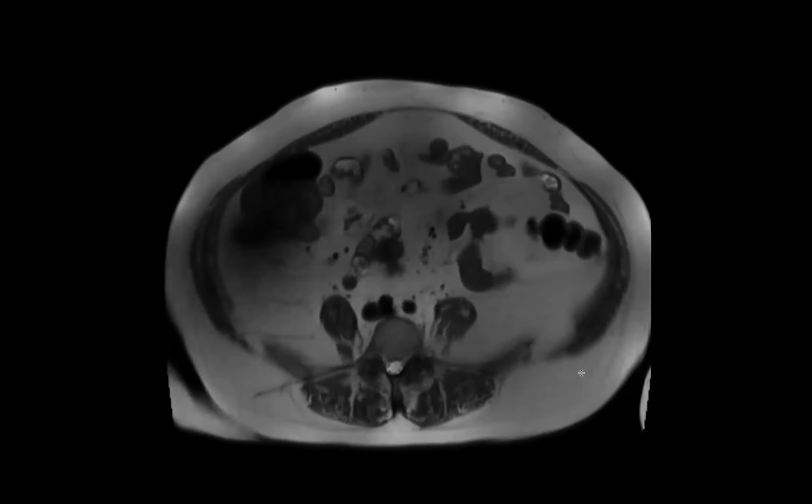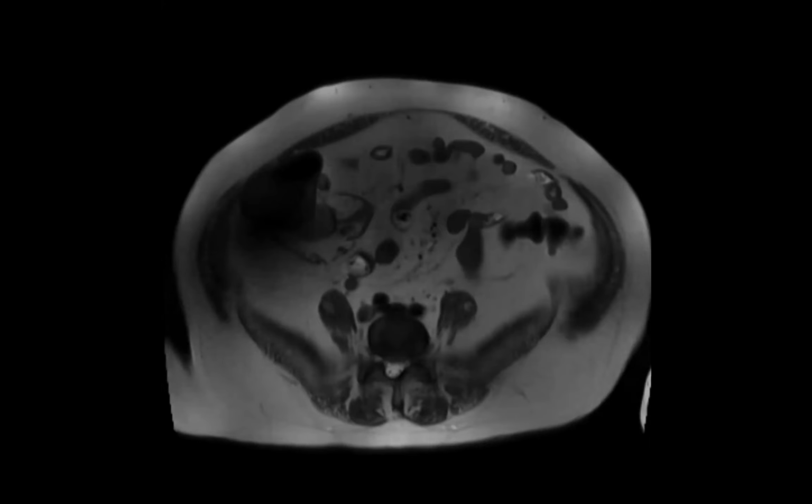Something going on with their colon? Let me go back to the coronal. Like a spiculated edge. There's like fecal material. Someone said cecal malignancy. There are nodes. Good. So here it is right there. It's maybe at the hepatic flexure, right colon. There's a mass right there with T2 intermediate signal. Like Aarti said, it's kind of irregular. You lose the normal serosa, and then lymph nodes. There's lymph nodes right here.